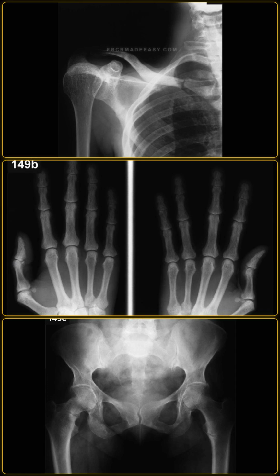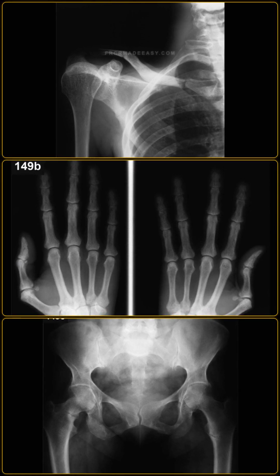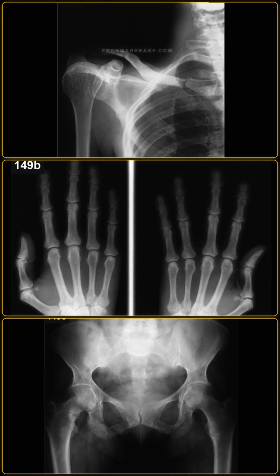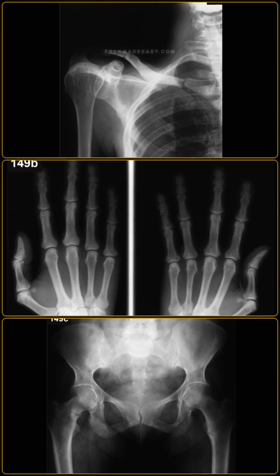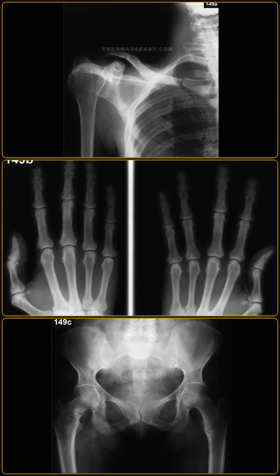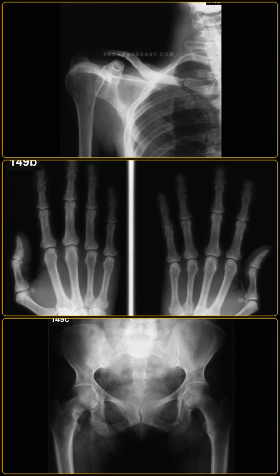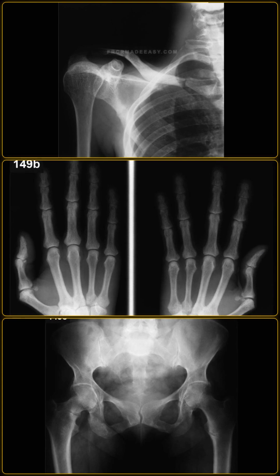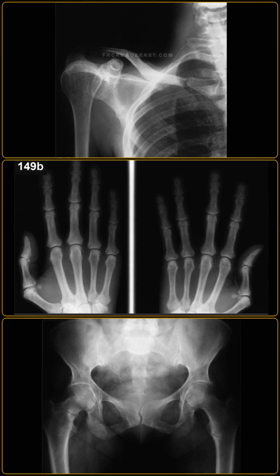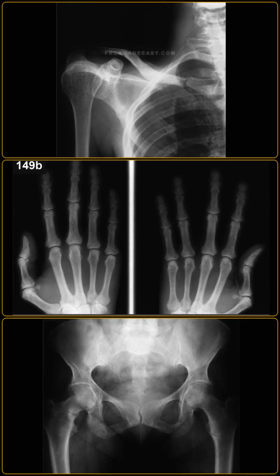In that case, as a radiologist, I would recommend comparing these radiographs with prior imaging to evaluate the progression of osteopenia and fractures. I would suggest obtaining a non-contrast CT scan of the pelvis and femora if the looser zones are equivocal, or to assess for occult fracture extension. I would also recommend correlation with serum biochemistries, including calcium, phosphate, alkaline phosphatase, parathyroid hormone, and vitamin D levels. I would communicate the insufficiency fracture to the referring team and recommend referral to endocrinology or metabolic bone specialists for vitamin D and calcium replacement therapy.